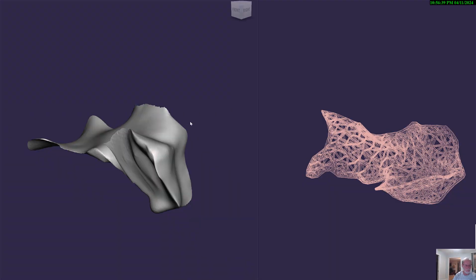This is a demonstration of what we can do to print a bone graft fill from a unilateral cleft palate into a lattice set. I'm just showing you for demonstration. We can probably use more sophisticated software, but this is basically the concept.